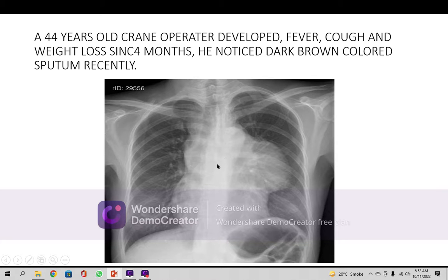So, benign tumors are possibilities, arising from the mesenchyme, and mesenchymal tumors are possibilities. Most probably here it is a mesenchymal tumor. There are a lot of mesenchymal tumors arising from this area, which I mentioned, the upper part of the middle mediastinum. So this is probably a mesenchymal mass or tumor which should be investigated further.